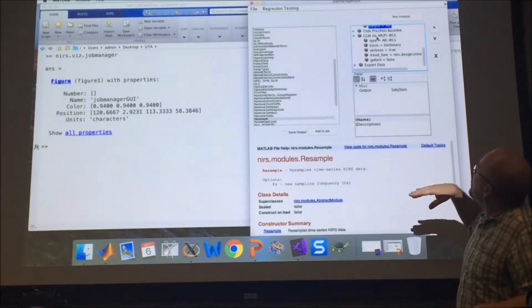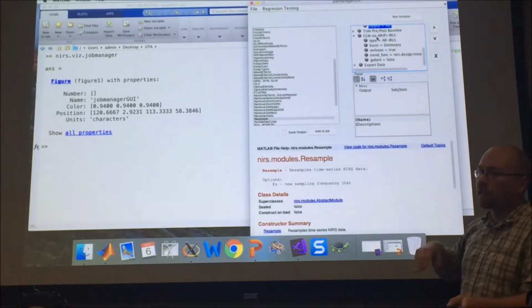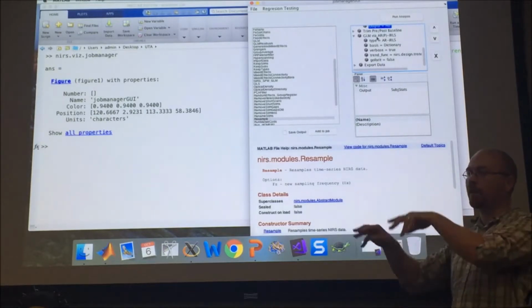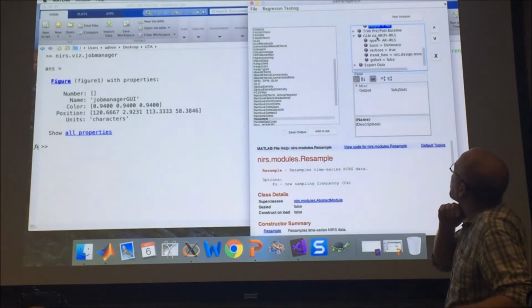The trend function, by default, uses just a DC regressor, just a constant, but you can put in polynomials or discrete cosine transforms to get rid of a little bit more of the slow drift. Same rules as fMRI.